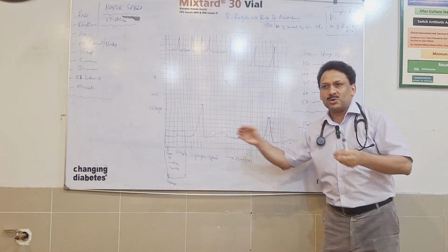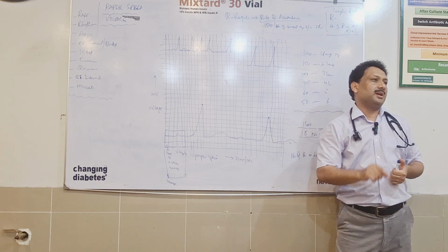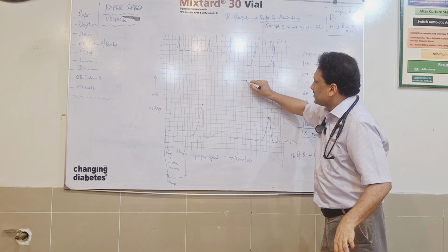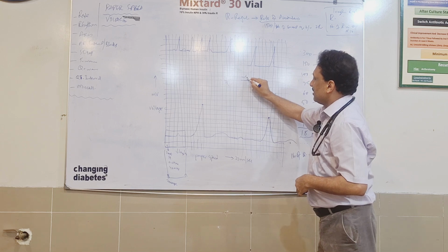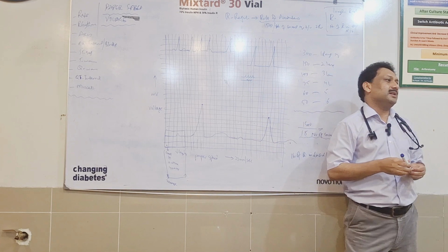So as this will slow down, there will be a gap between the flutter waves, and you can easily pick after how much time the next flutter wave is coming. Like I'm giving you an example. If it is at normal speed, it's something like that. You double the speed, then it will be like that. So you would be able to calculate things the easy way.